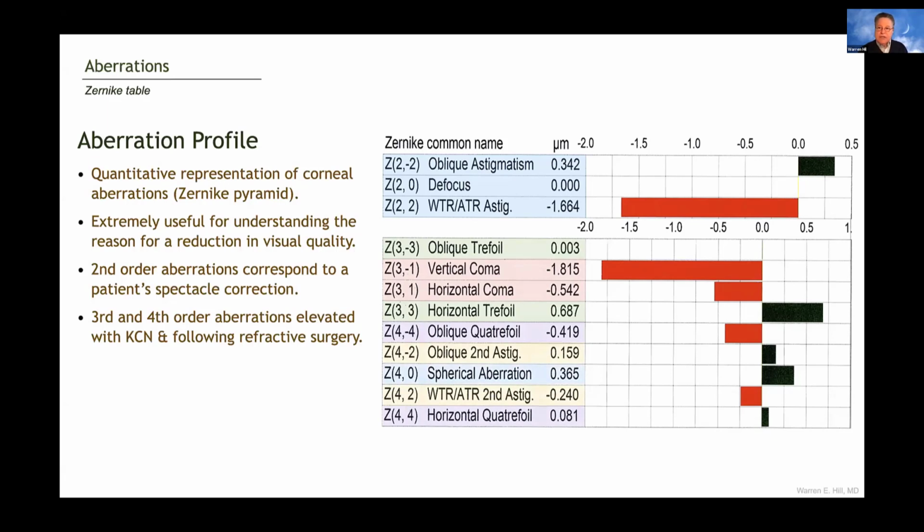And by the end of this talk, you will be able to look at an axial curvature map and know what the aberration profile is. None of this is difficult. It's just a little bit unfamiliar. And this is very, very important for those of us that implant multifocal lenses, because this can come up with a go or no-go decision as to those types of lenses.